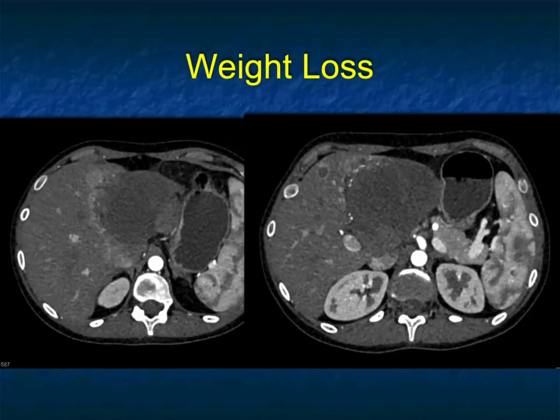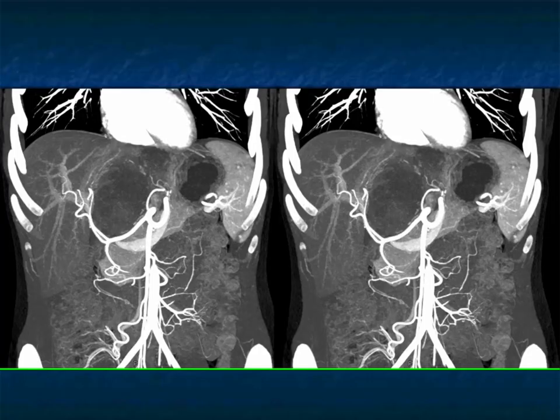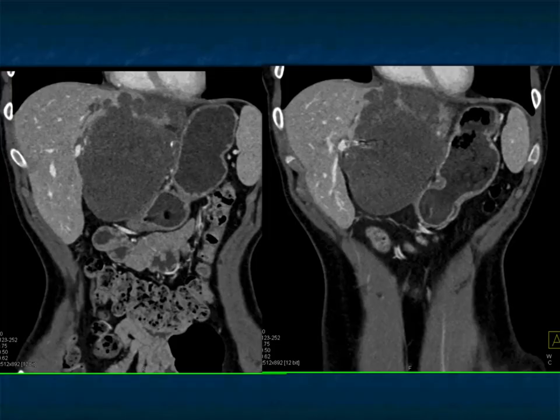Another mass, left lobe of liver, again relatively hypervascular at the periphery, and perfusion changes seen at the periphery, though the dominant component of the mass is irregular but not very vascular. You can see stretching of the hepatic artery, the suggestion of some neovascularity. You could see it on the venous phase imaging. Could this be cholangio? It doesn't quite look like cholangio. It doesn't look like hepatic cyst, doesn't look like hepatic adenoma, FNH. Could be a cystic metastasis.